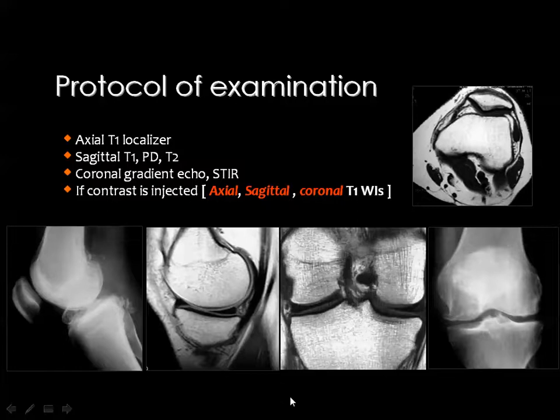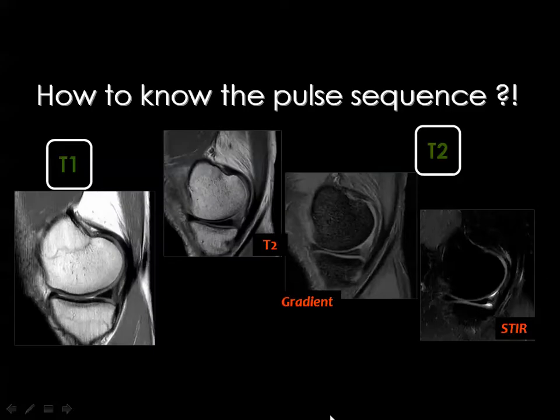Then I will emphasize whenever discussing each joint which is the suitable plane of examination and the suitable pulse sequences to be followed.